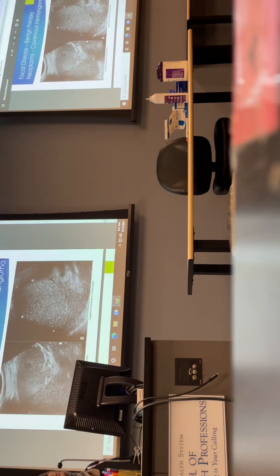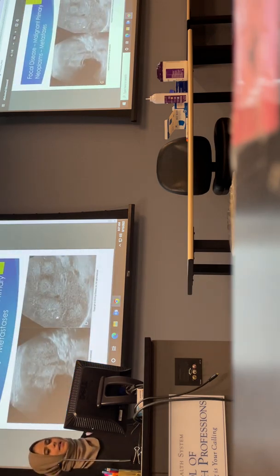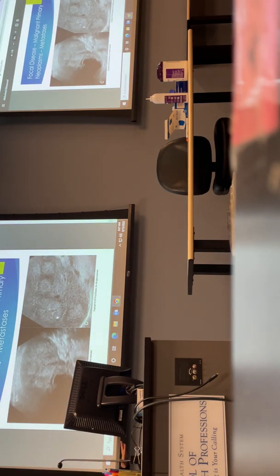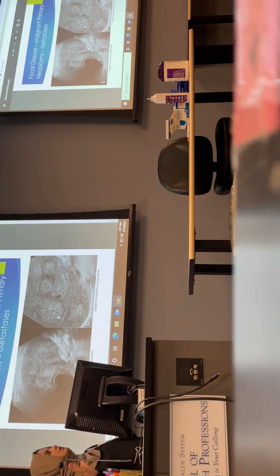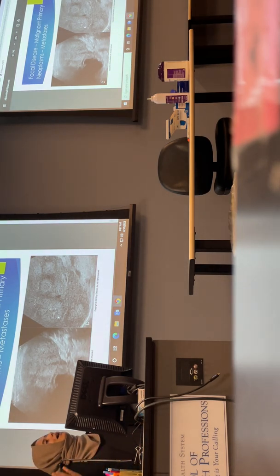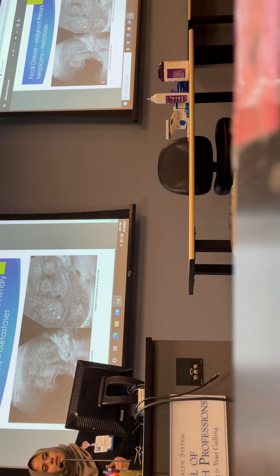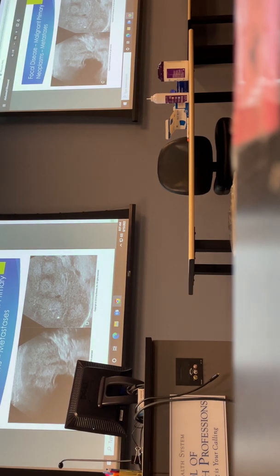And remember, if I give you images for malignancies, if you've got a mass with color, the more complex it looks, and the more isoechoic it looks to the normal parenchymal patterns, those are true signs that this is more than likely going to be a malignancy. That goes for anything. I could give you images from anywhere. If I'm showing you a mass that has extensive color flowing to it, looks very complex, and very isoechoic, that should make you think, if the question is benign or malignant, there are more chances of this being malignant than anything else. Everybody okay with that?